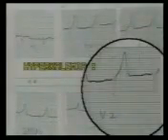Now this ECG shows very tall, narrow and peaked T waves. These are typical of hyperkalemia. Note that they are seen in all the chest leads and they are also seen in the limb leads. So this is hyperkalemia or raised serum potassium levels. This is another ECG of hyperkalemia. Note the tall peaked T waves more than 10 mm high in all the leads.